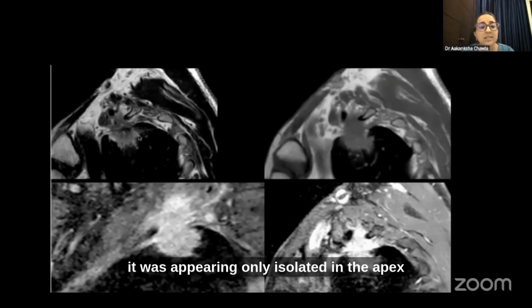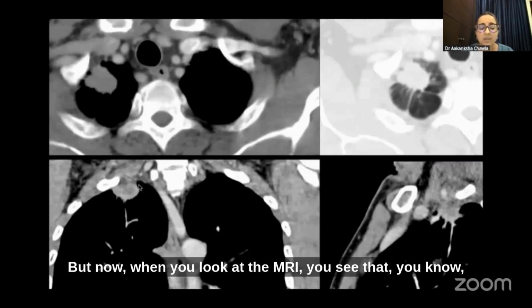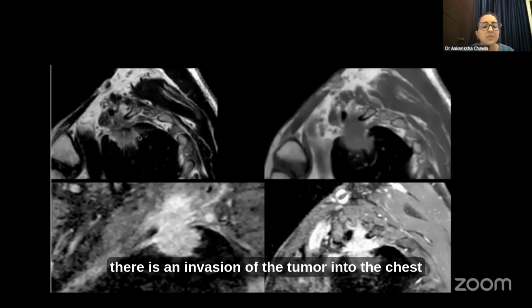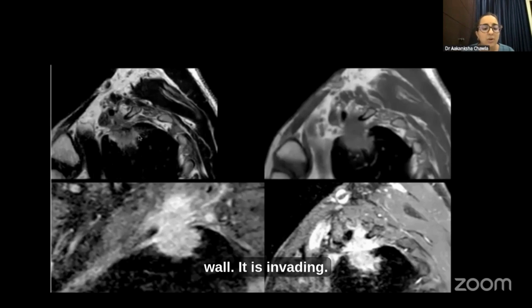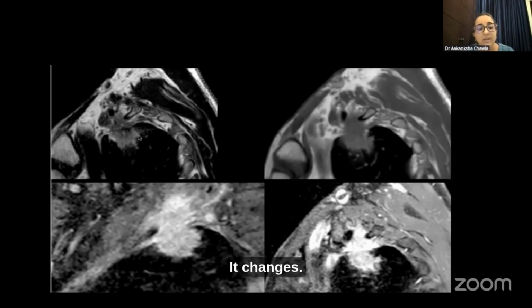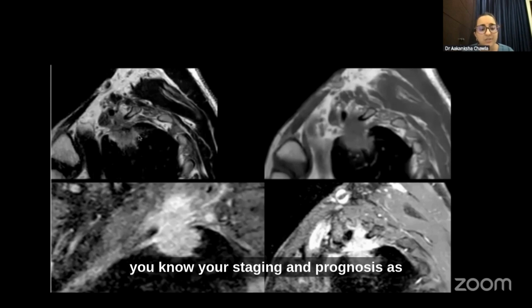Earlier on the CT, it was appearing only isolated in the apex, as you can see here. But now when you look at the MRI, you see that there is an invasion of the tumor into the chest wall. It is invading. So this has actually changed your stage of the tumor. It changes the entire treatment plan, and it further also changes your staging and prognosis as well. So this is something important and you must keep in mind.